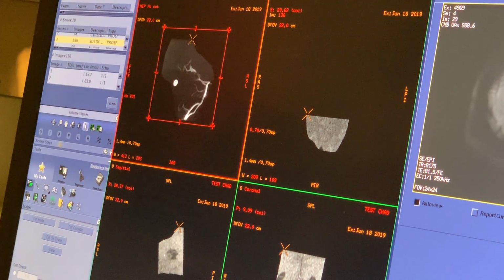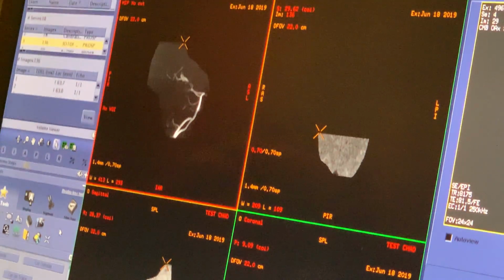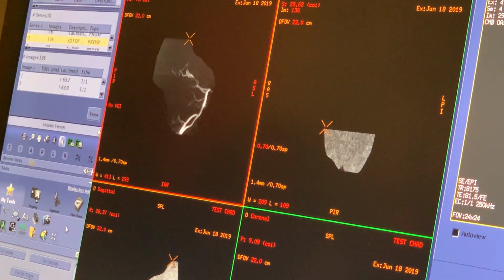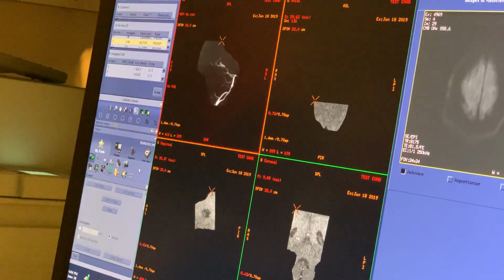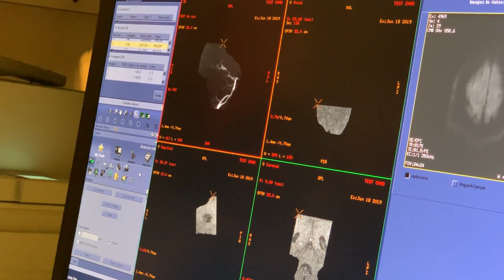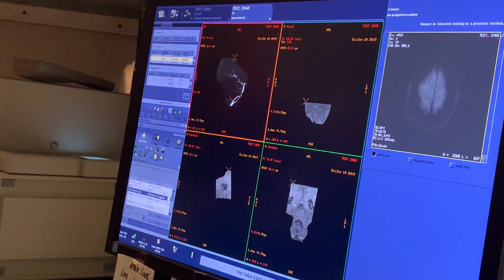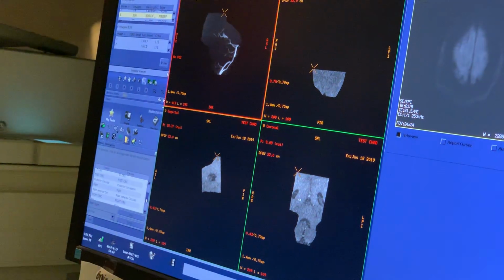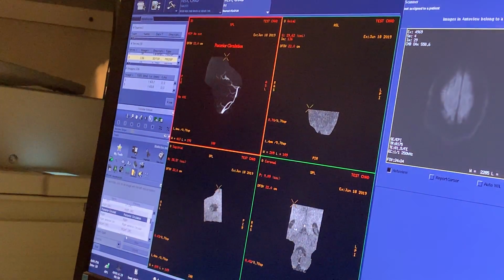I center it up. Now, I've seen people say put posterior circulation on this, but you're not identifying left side from right side, so I don't generally. If a doctor doesn't know what they're looking at, they don't deserve to be looking at the image, you know. But there are some people, you can go here and put posterior circulation on it right there if you wanted to, just like that.